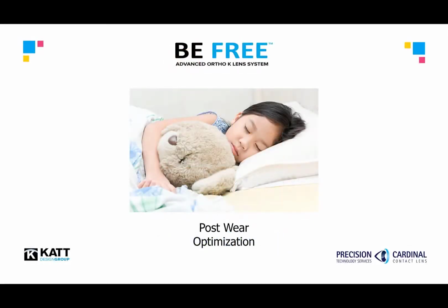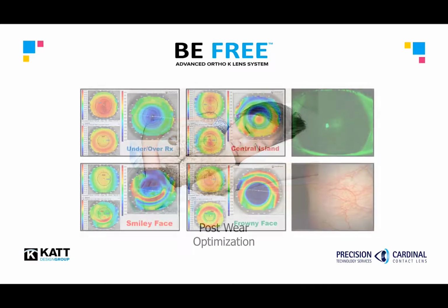This video will focus on the post-treatment response in the BeFree software for users with an integrated topographer. If your instrument isn't linked through the CloudLink tool, see the post-fitting video for non-integrated topography users. This educational tool is designed to walk you through the simple steps of modifying and optimizing your BeFree outcomes to create the best possible patient response.